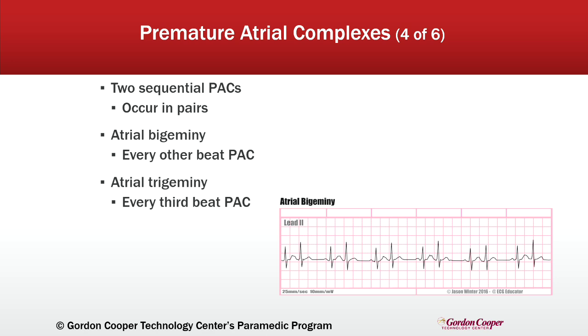So these patterns help in identifying the rhythm and then just understanding how the PACs are affecting the overall heart rate and rhythm. Although these variations might not be immediately life-threatening, it's still important to monitor how often the PACs occur and whether they cause symptoms.